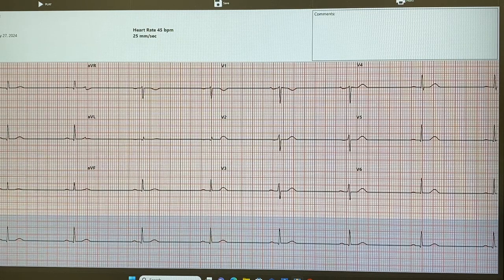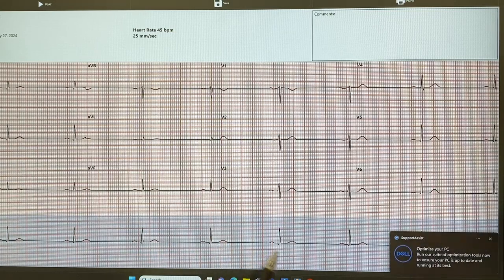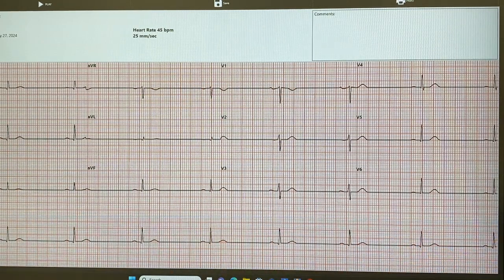Next, we're going to look at the T wave. Is it tall, normal, or inverted? It's normal, one quarter to one third of the height of the R. Can you X that out for me, please? If it's too tall, what are we worried about? Hyperkalemia or MI, infarction. If it's flat or inverted, we're worried about hypokalemia or ischemia. Sometimes the infarction or ischemia may not show in the ST segment, it may also show in the T wave. So we're not worried about that.